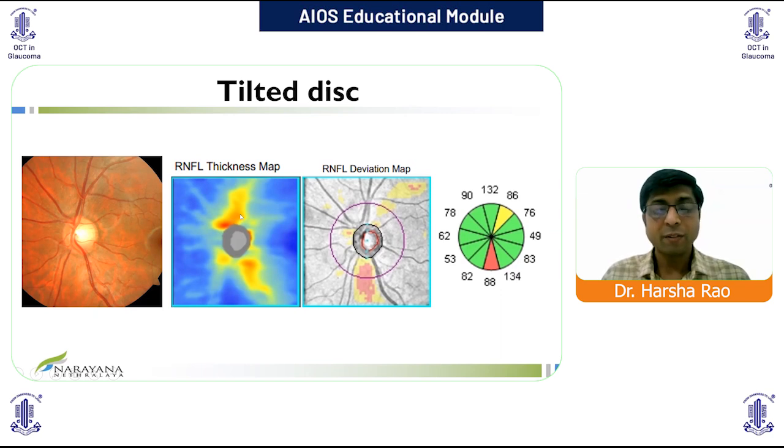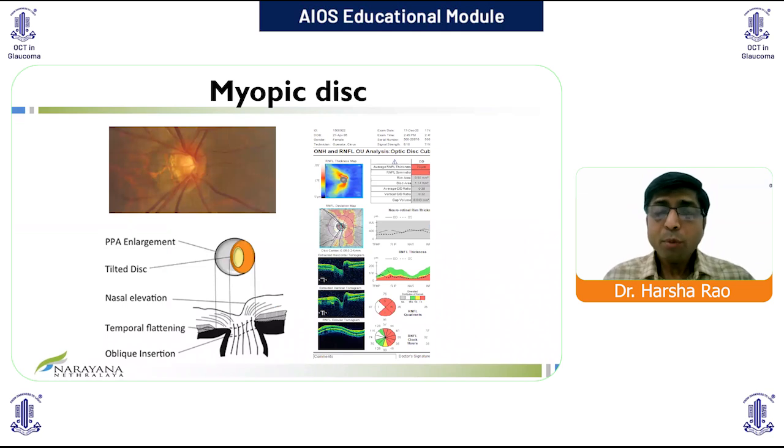If you imagine a slight clockwise tilt to the entire scan, then you could visualize these defects going away. The other important ocular characteristics to pay attention to before the interpretation is to see whether the disc is myopic.